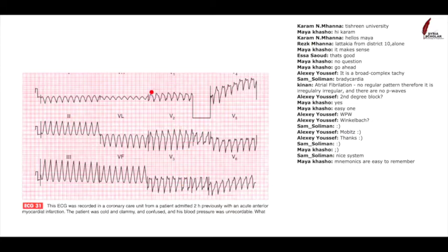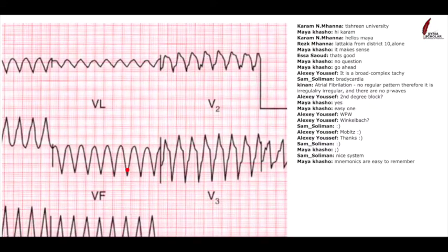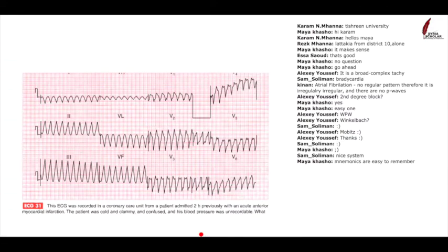All right. Now this is another kind of broad complex. So here, like we said before, you've got QRS complexes, which are a lot broader than 5 small squares. See, that's a really big QRS complex. And the other thing is, there's nothing else going on. There are no P waves, and it's just exactly regular, all identical, perfectly identical, broad complex.